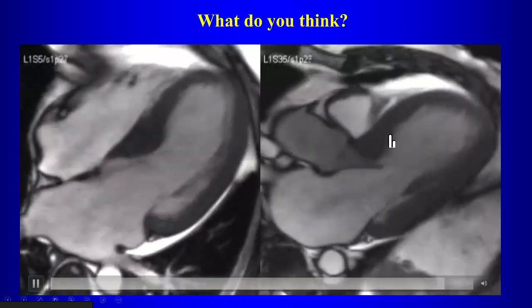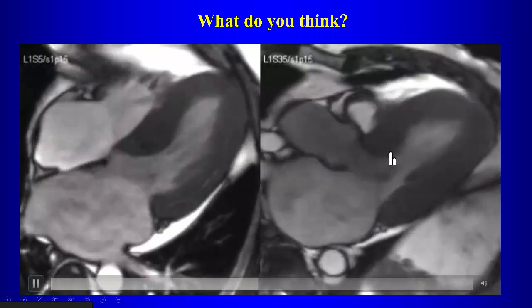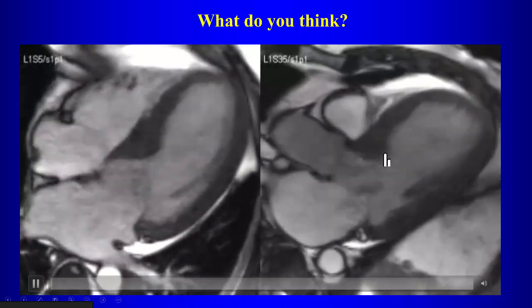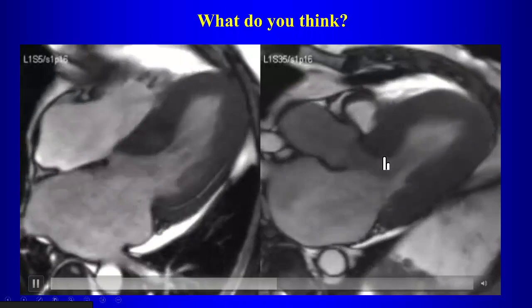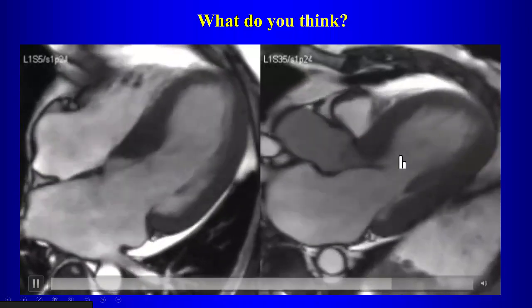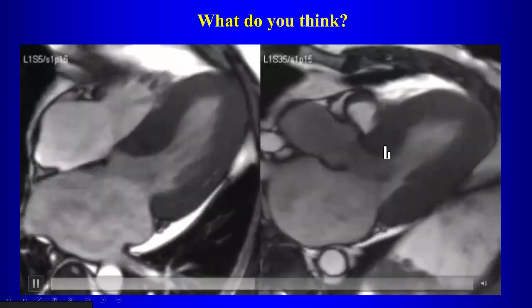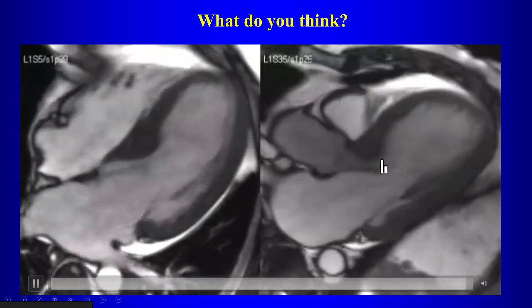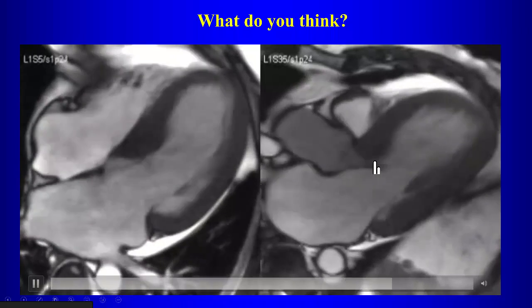Septal thickening. There's septal thickening, right? So there's thickening here in the septum extending into the outflow tract. So what are we dealing with? What do we have here? Yeah, so this is hypertrophic obstructive cardiomyopathy, where there's hypertrophy of the interventricular septum extending into the outflow tract. That's causing subaortic stenosis in the outflow tract.